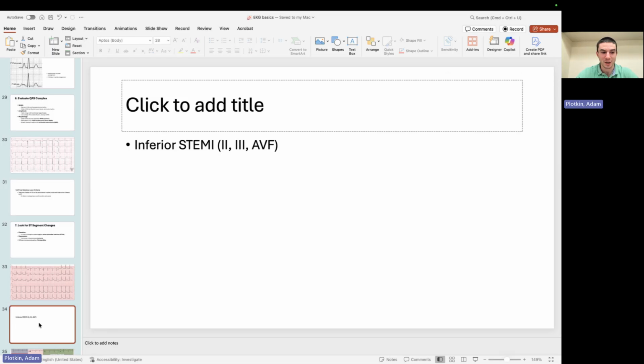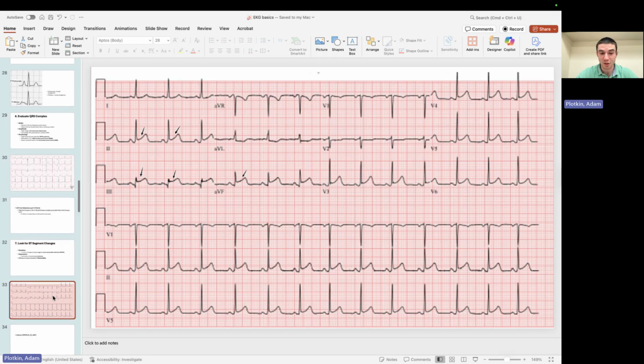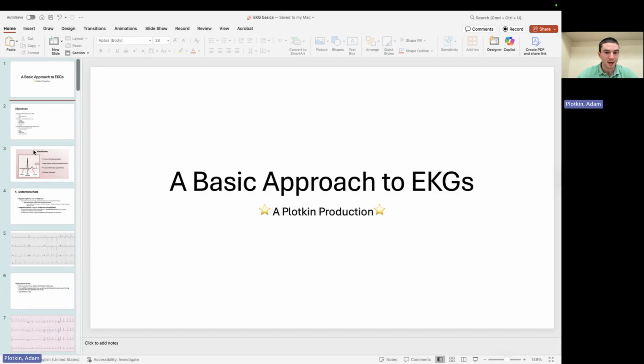So again, yeah, sorry, I didn't see on the first time I pasted this, and I didn't even see the arrows on here. So sorry if that gave it away, but it's a good example of recognizing the ST segment elevations. And I'll go all the way back here.